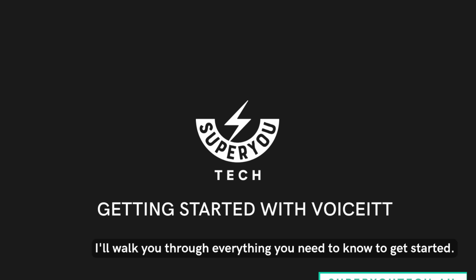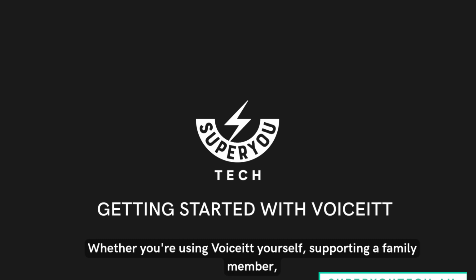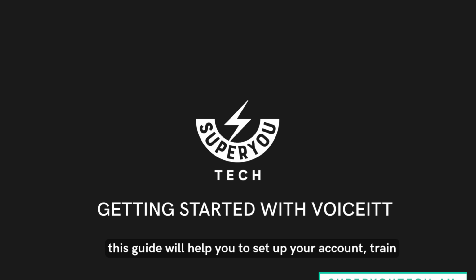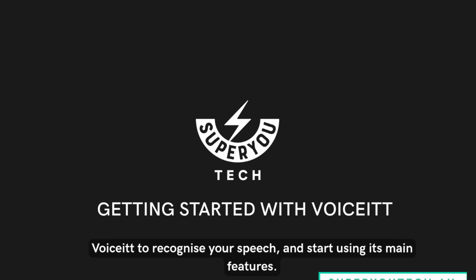In this video, I'll walk you through everything you need to know to get started. Whether you're using Voiceitt yourself, supporting a family member, or working as a therapist, this guide will help you to set up your account, train Voiceitt to recognise your speech, and start using its main features.